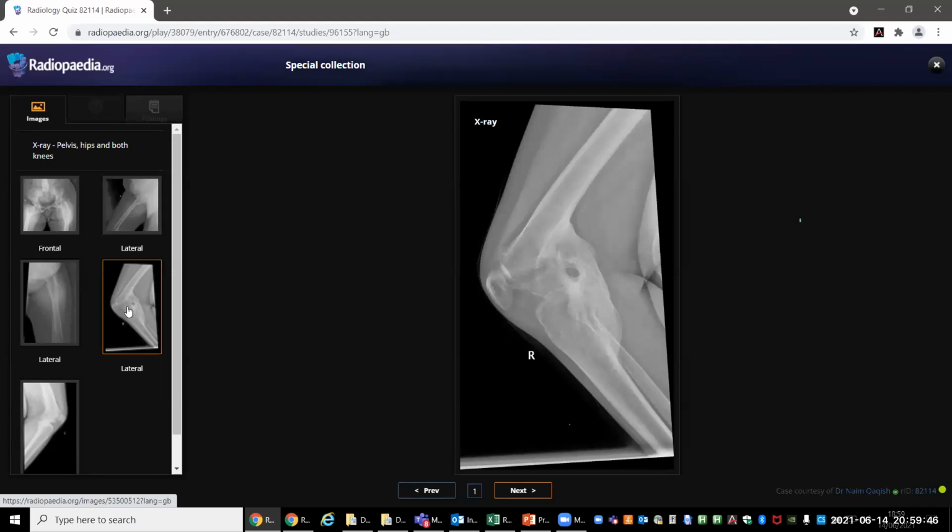So I think this patient is not using his extremities because there is a lot of flexures, and secondary to the flexures there are bony bridges between the bones. So either it is secondary to a trauma, multi-trauma, or a syndrome, maybe a congenital syndrome, but I can't find it because there are bony bridges fusing.